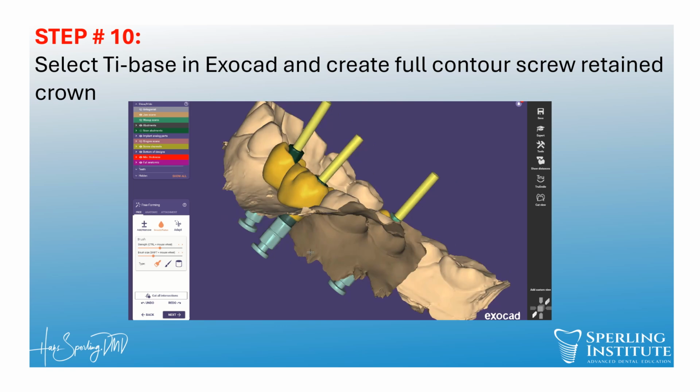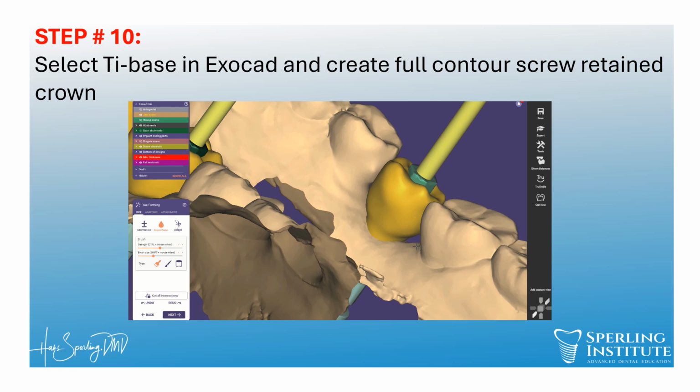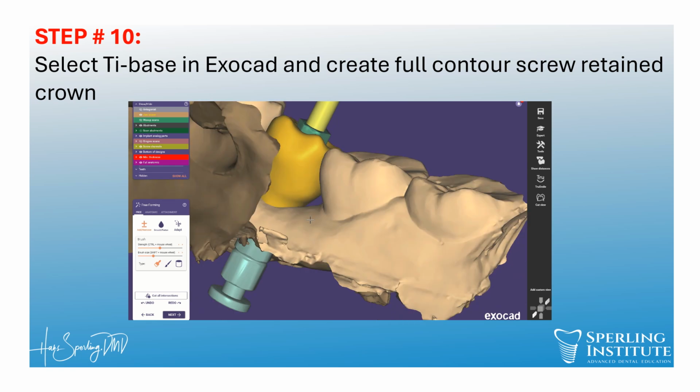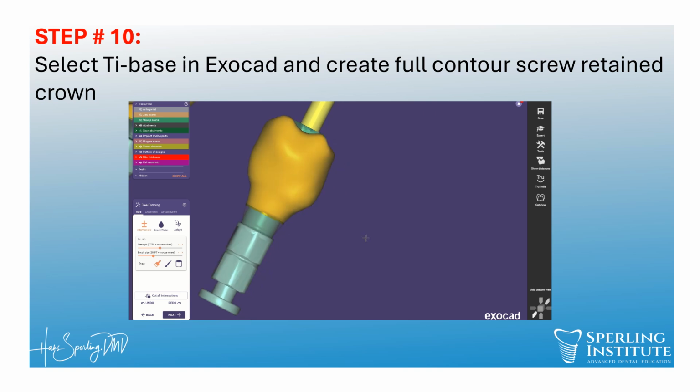So we call it number 30 because it's in the position of 30, but because of the spacing, it does not have the space for number 30. Now here we can add a little bit of material to reduce that spacing, that black triangle.